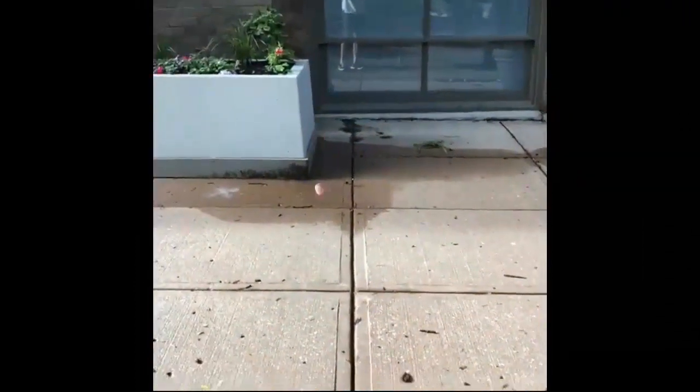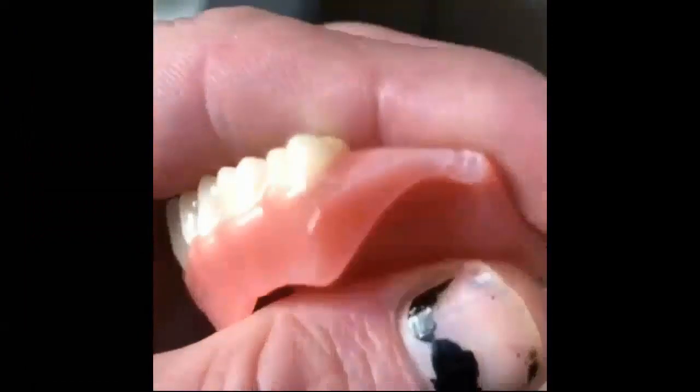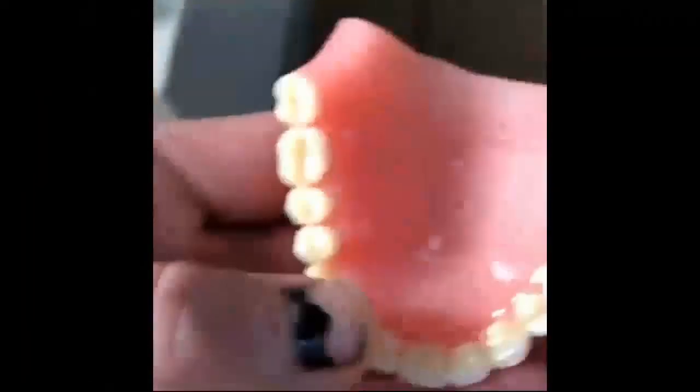It doesn't fracture. The previous 3D printed dentures would basically have exploded down here, but here you can see the denture is basically almost intact, and you can see there's a small fracture here. You will also see other examples where the dentures have been run over with trucks, etc.